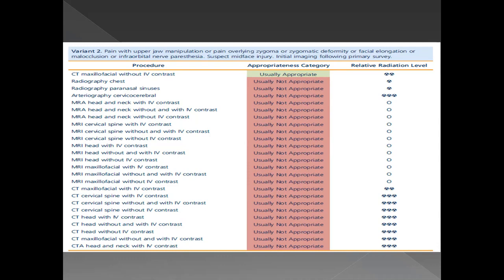Basically, you might be able to diagnose that a fracture is present, but it does not tell you anything about the displacement, any comminution, etc. So for treatment planning purposes, these X-rays are not very useful. So you will sort of be reliant on your per-op findings, that whenever you open the zygoma through a Keen's approach or any other approach, then you might be thinking, oh, I need to plate this, or do you think this will be stable enough with zygoma elevation.